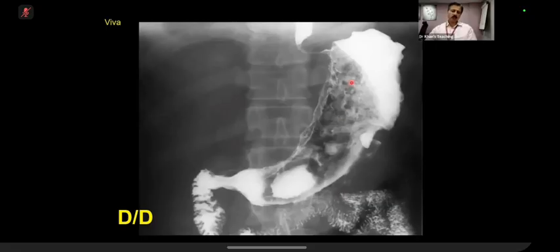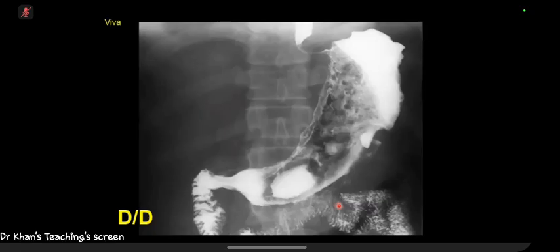Excellent. What do you think overall? Are you happy with this appearance of the stomach? No, so the mucosa is grossly abnormal and the stomach does not distend as much as I would expect for this amount of contrast administration. So I think that there is evidence of generalized luminal infiltration with large target lesions. My number 1 differential is lymphoma, but other malignant infiltrations would be included.